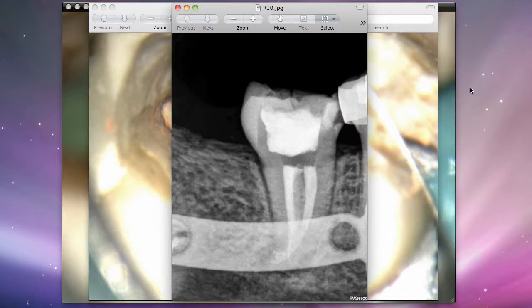The periapical radiograph shows a pretty typical presentation after you fill these teeth. And what we can see, there's the mesial canal, the distal canal with the fin coming off it, and that's filled with sealer and hopefully some GP as well. And we can see this area where we've got the C-shaped distal part where the two canals merge as well. Appears to be reasonably well filled, and down through to the apical portion.